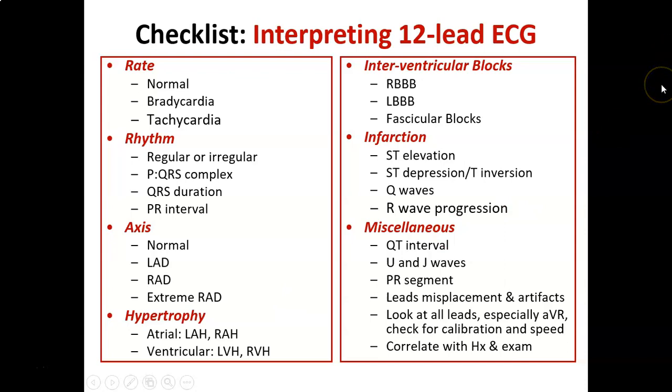So this is the checklist, and there are many ways to interpret the ECG, but in this course we are going to apply this checklist as a stepwise approach. Step 1 is the rate. The rate can be normal, bradycardia or tachycardia.